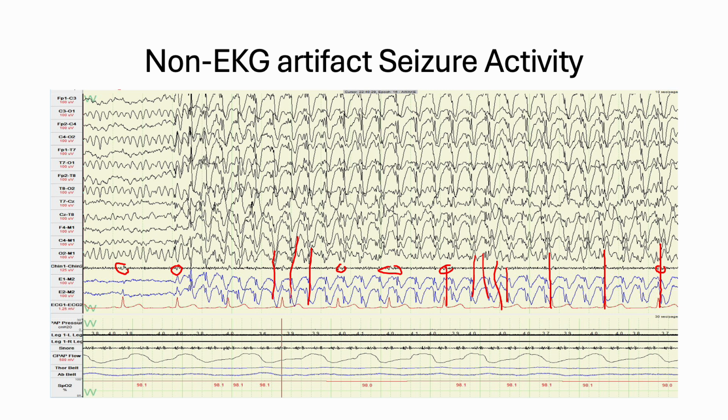But even before that even starts happening, you can see back here, this is nice alpha. This is also a 10-second window, which is how we read EEGs. This is alpha, and you can see there's no EKG artifact in that. So that's a real study. A lot of these that look like this are ones that I've run. But that is real, and that's how you can tell if something's real or not: if these are clean-looking waves, and the spikes do not occur when the heartbeats do.